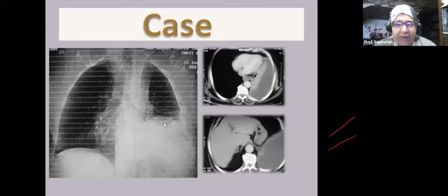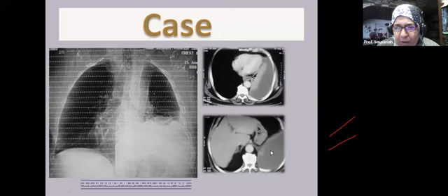In this case, this scanogram will show what looks like an elevated left cupula. However, if this is an elevated left cupula, they can see the haustra of the colon far below. It should be just below the cupula. It is not. Is there something below the cupula pushing the haustra? No, there is nothing. Why am I so sure that there is nothing pushing the haustra? Because they are very uniform. There is nothing indenting them. In the axial image, you will see clearly that this was actually a loculated diaphragmatic effusion, with underlying partial lung collapse.